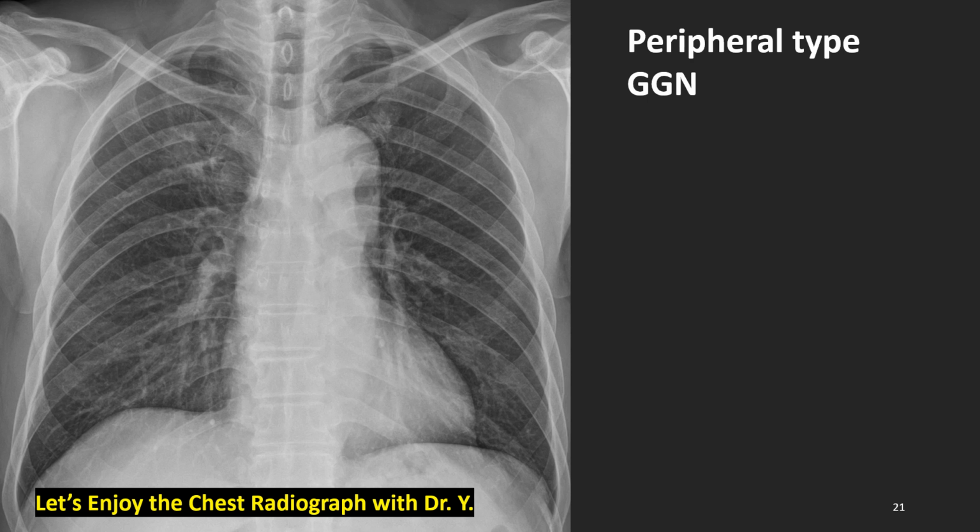Let's look at this frontal film. What do we see? And what do you see? Eureka? You find it? Not yet? Yes. Look at this area. Looking good, looking normal. How about the other side? Something hazy, something increased opacity.